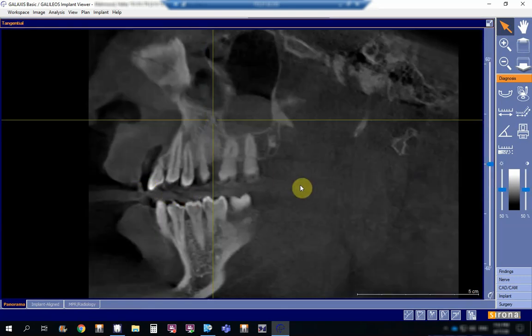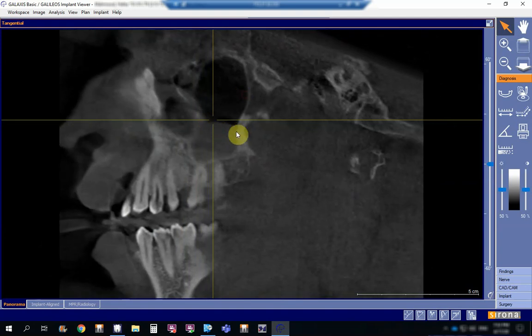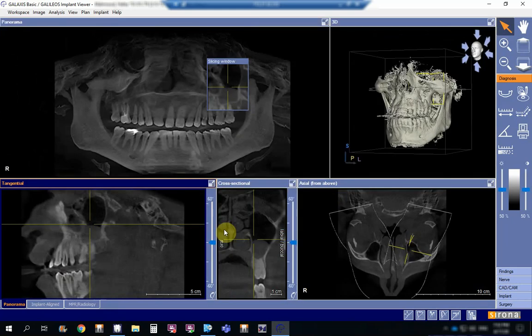In the maxillary sinus, you don't see as clear as the other one, because you will have this kind of dome-shaped radio-opacity. It could be a thickening, it could be a polyp, it can't be a collection of fluid actually, because fluid does not take this curved shape, it goes in a more flat position. Anyway, we'll discuss this when we come to the diseases of the maxillary sinus and how it is seen in the radiograph.